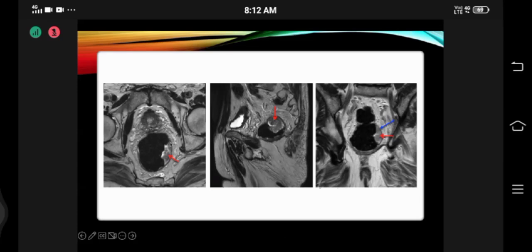So this is again an early tumor where the black line is nicely maintained. You might not always see this, but this is a polypoidal tumor. And if you have any doubt, you can always do an endoscopic ultrasound, and if it is confirmed that it is T2, then the patient can undergo upfront surgery.